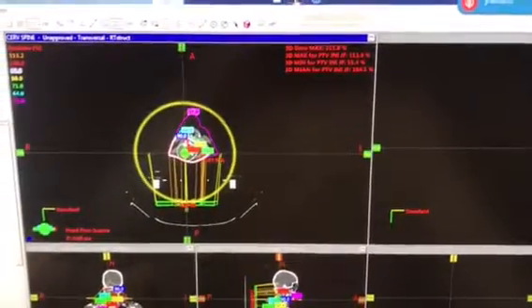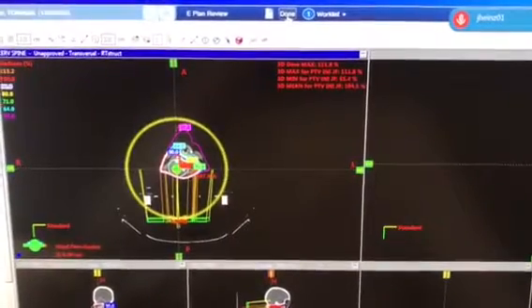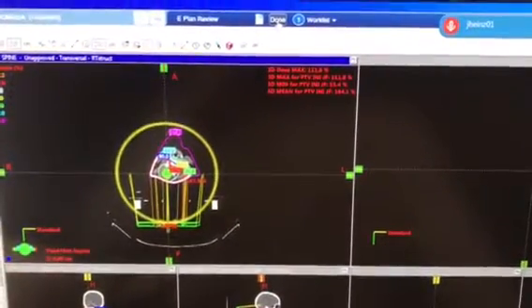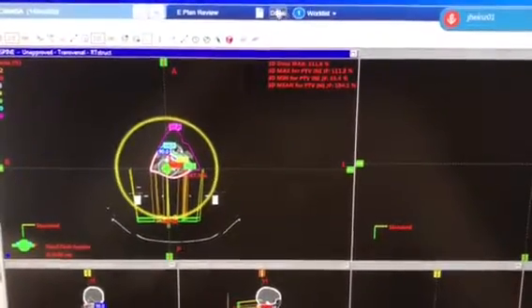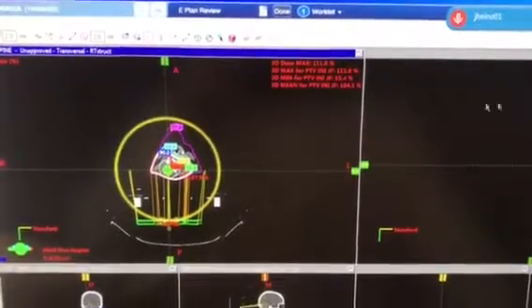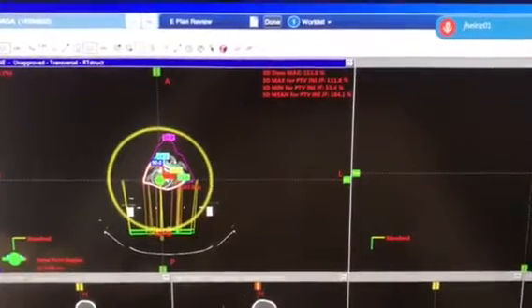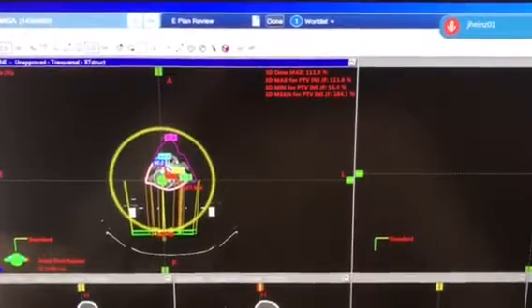So instead of me emailing the dosimetrist or checking off the task in the task window, which I find very inefficient, all I have to do is click done and it automatically goes back to the dosimetrist. I feel like that saves quite a bit of time instead of having to communicate back and forth. Dosimetry doesn't have to let physics know when it's ready to QA. It's automatically generated for them. Peer review tasks are automatically generated instead of having to keep a list or email Ben to check my contours. It's automatically generated.